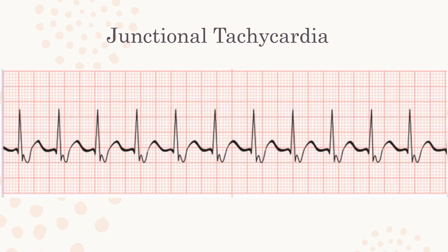So I keep telling you that the P wave can come before, during, or after. And if it comes during, obviously it's absent. We don't see it. If it comes before, it's typically inverted and the PR interval is less than 0.12.